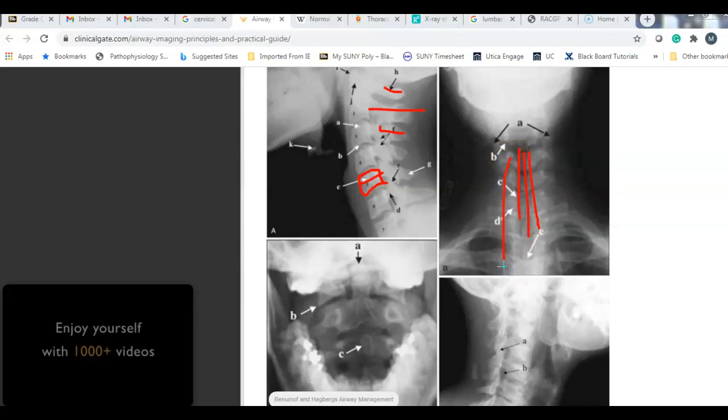I actually had a patient who had a deviated trachea. She had a large fatty tumor that was pushing it aside. Thank God it was benign. She had it taken out. She was fine. So alignment of the bones, and alignment, I guess, of soft tissue. I had a patient who had abdominal calcification of his aorta. So you want to make sure that with that aorta and that calcification, you look at where the alignment of it is. Where is it going? So alignment of the bones and, not really soft tissues, but sort of deviation of that alignment. Bones, cartilage. Okay, let me clear this.